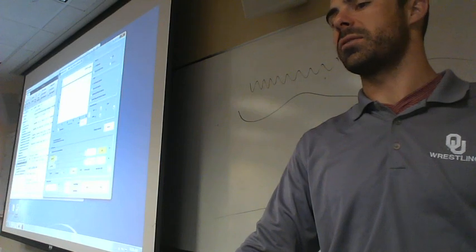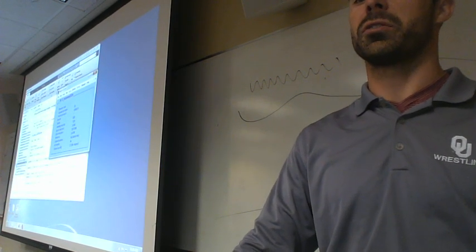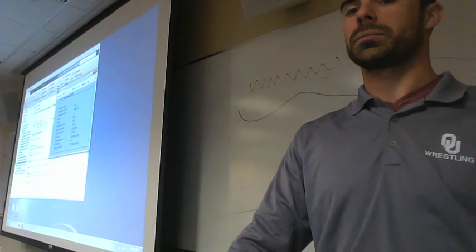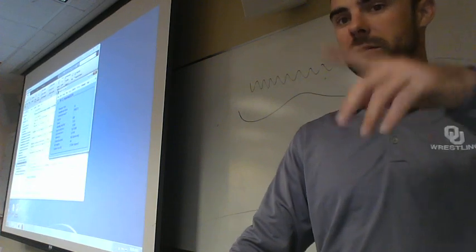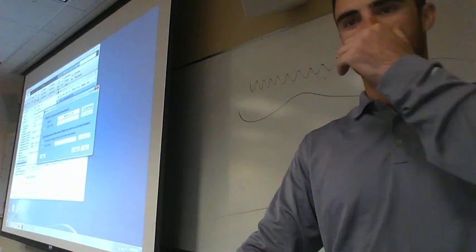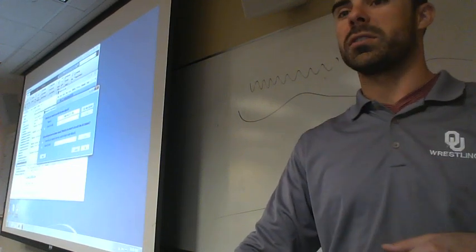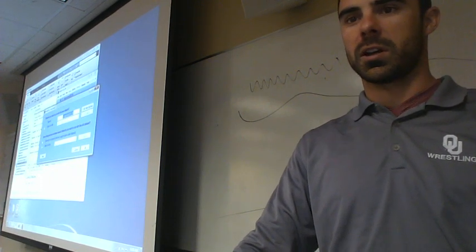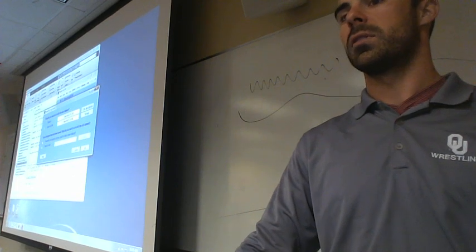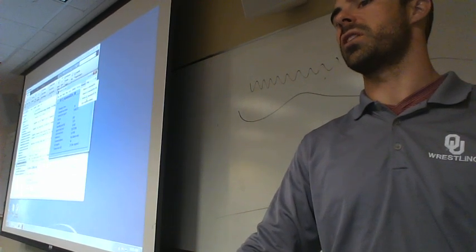And you just hit apply. And then you'll do the saving function. So it runs, it thinks, and it'll ask us what we want to do. I'm running this again, and it'll ask us this, and I've already done this. You just press OK. What I did was I copied this, then I hit this button here to save this file, pasted the same name, and hit OK. So now I have 3 data sets because I just did that twice.